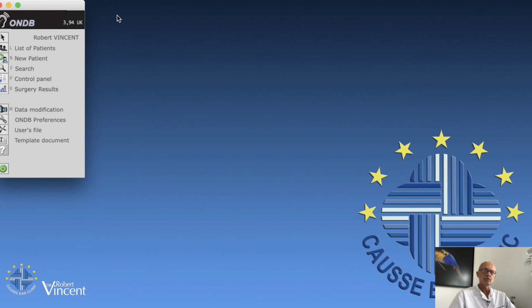That will be easy to do. And also, by the way, you can use this program for any other specialties like cardiology, pulmonology, etc. You can customize the program very easily, as you will see. To do this, we need to go to this control panel, but I will demonstrate that later, and that will be easy for you to do.